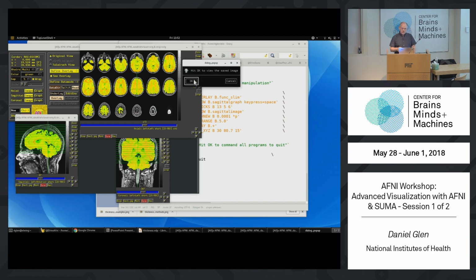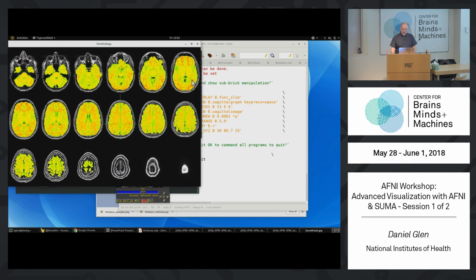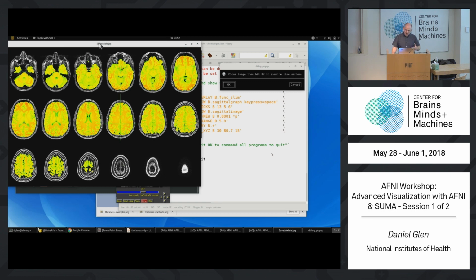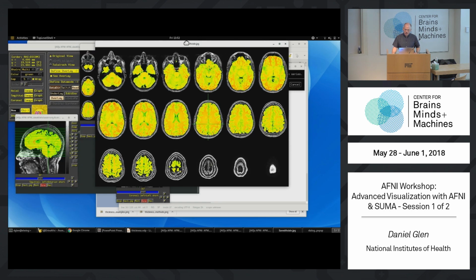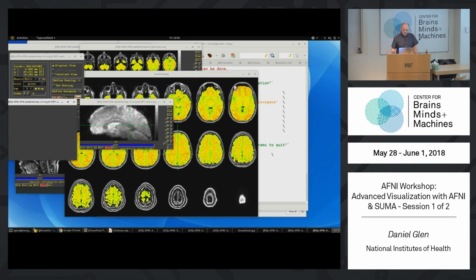Okay, now it's set the montage for us, and the montage is still available. We can move through the image. We can select OK. And it's now saved the axial image for us, and it's opened it up for us to see with AIV, the AIV program. So we can see our montage as a separate image. So these kinds of things are really useful for quality control. You want to see all your slices. You want to see overlays, underlays. It's an automated way to do all this.